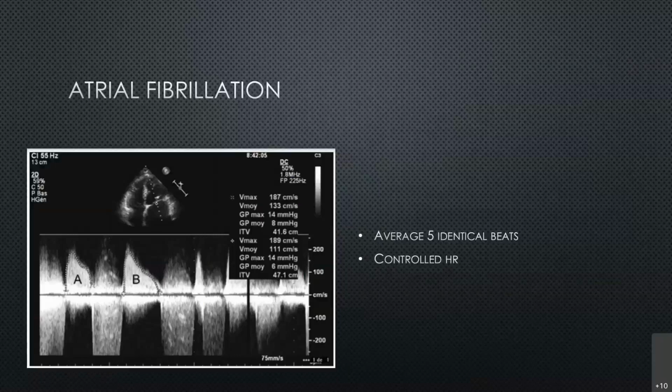But again, at the end you're going to put all the information together, right? Like the pulmonary pressures, left atrial size, and history, all that. But one thing I would like to say is, when people are so used to looking at aortic stenosis and try to translate it to mitral, there'll be a problem, because with aortic, we get used to looking at the planimetry, the area also, right? Just looking at the valve, like is it opening well or not.